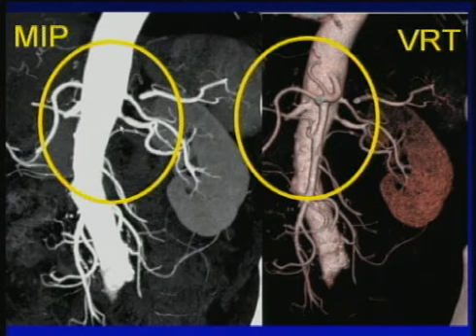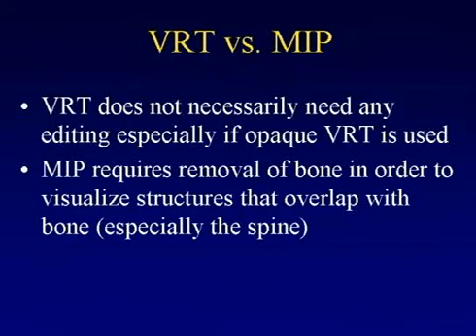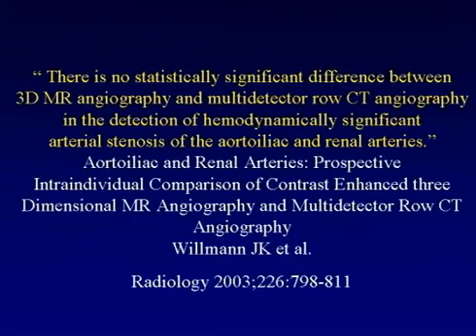So in terms of being able to accurately detect stenosis, define, and quantify, you need to be outside that axial plane as well. MIP versus volume rendering has been shown to be more accurate, but as I commented, there is some variability in terms of users. There's also variability in terms of workstations. One advantage, of course, of volume rendering compared to MIP is that you don't need editing of the data set, so that indeed can also potentially help your workflow.